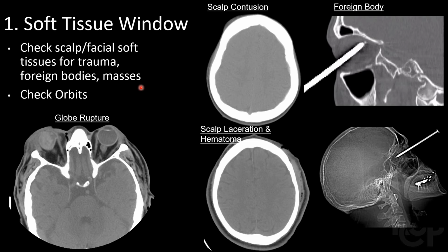It's especially important to check for signs of asymmetry, both in terms of tissue thickness as well as in terms of attenuation. So let's take a look at some examples. If we look at the bottom left here, we see clear asymmetry between the right globe and the left globe. Compared to the left globe here, the right globe is deformed, and you can't see important structures such as a delineation between the posterior and anterior compartments or the lens, as you can clearly see in the left globe.